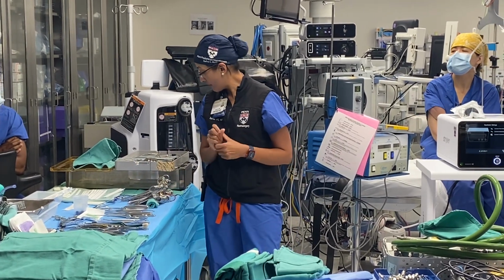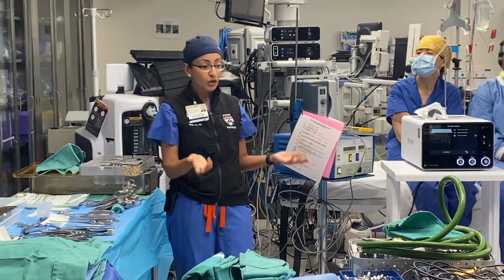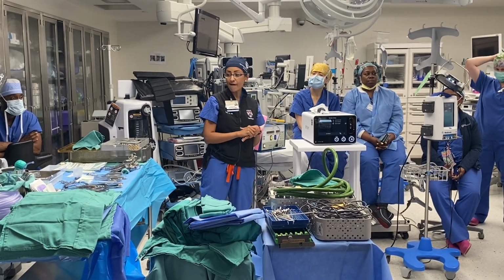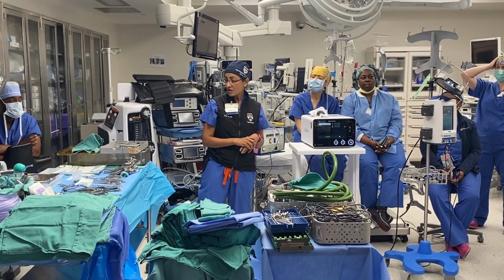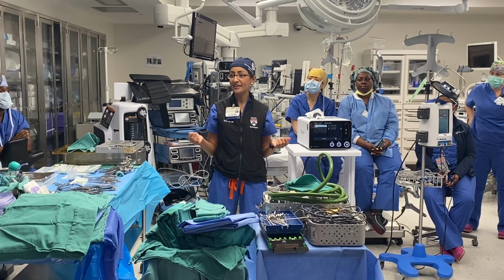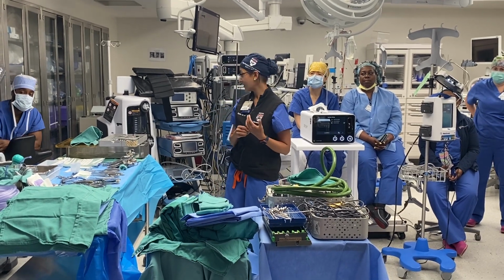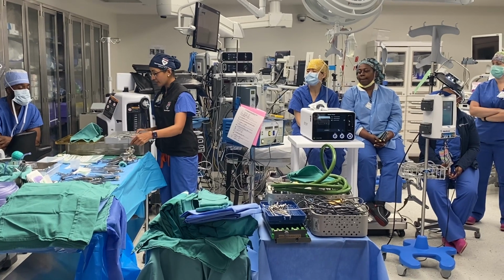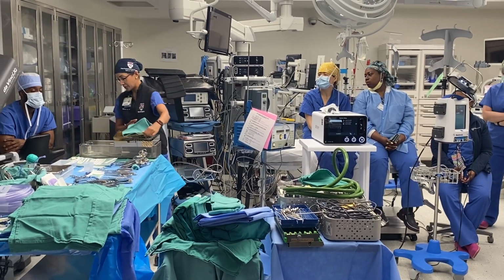And then similarly, we will put the bone flap back on, plates, screws, all that stuff. And, am I missing anything, guys? Lucy? Yeah, those are the big main things. I'm just looking at what other instruments you have here.